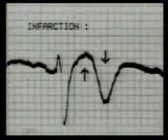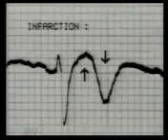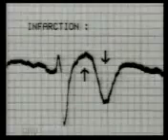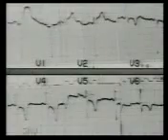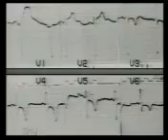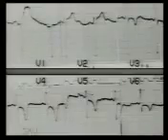Mild ST elevation with deeply inverted and symmetrical pointed T waves is typical of fully evolved myocardial infarction. The T wave remains inverted for about 3 months after the infarction. This ECG shows deep T wave inversion with ST segment depression in leads V3, V4, V5 and V6. This suggests a subendocardial infarct.